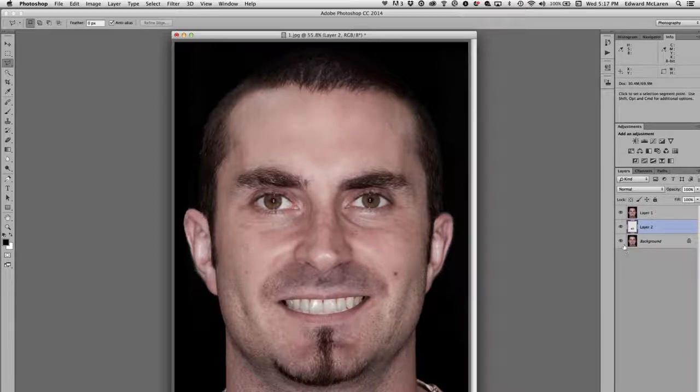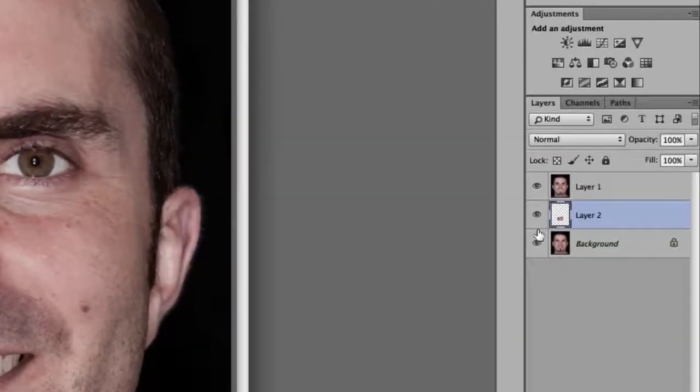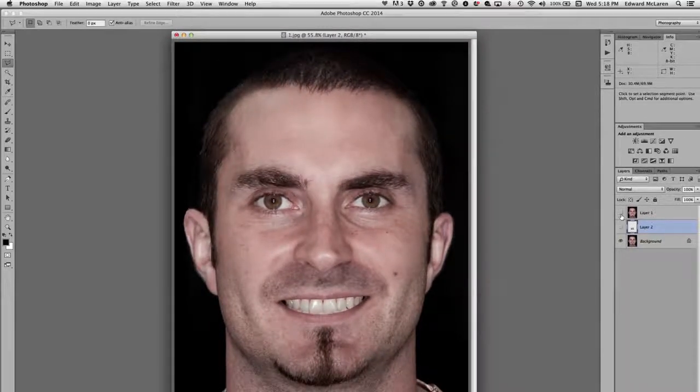All right, so, here is the before. I'll turn these two off, and I have to turn these two on for the after. Okay, before, after. Okay, now one of the cool things about this, let's just say we like this, and he likes this, and we could plug in as many smiles the same way as that from your smile library. You do exactly the same way.